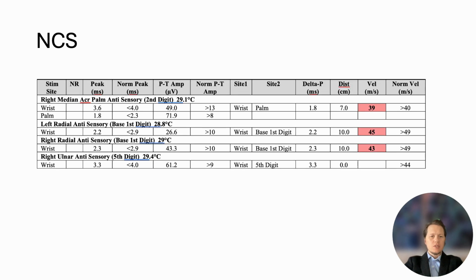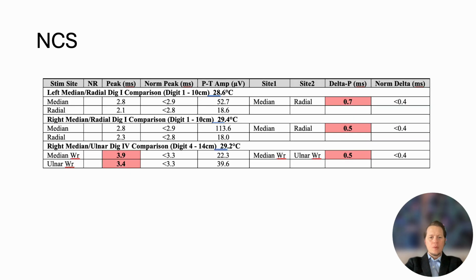So here we go, nerve conduction studies, and if you review this chart here, no real prolonged latency of median sensory across the carpal tunnel. It may be borderline, but with temperature correction, that would be considered normal. Radial sensory on the right, on their affected side, actually better amplitude than on the left, 40 versus 20, so that doesn't quite fit with a radial sensory neuropathy.